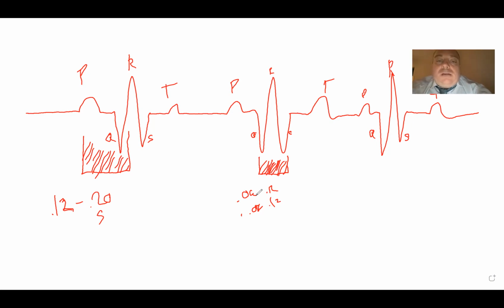So basically, the takeaway from this is if you have a QRS of less than 0.12 seconds, we can say that your QRS is a quote unquote narrow complex, right? If it's greater in duration, because remember, left to right is a measurement of time. So if something is greater than 0.12 seconds, like 0.16 seconds, it took more time to occur, right?